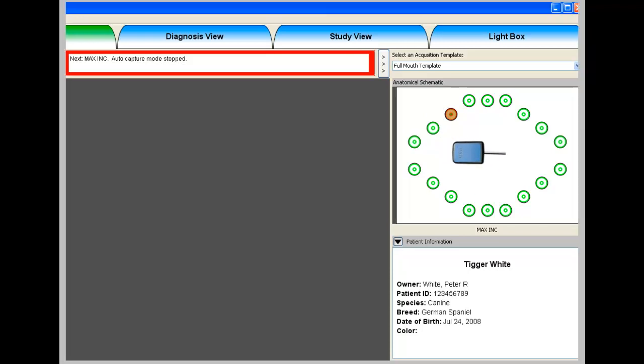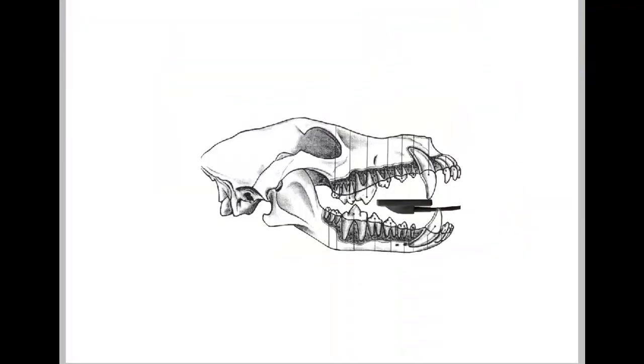And to take a look at our illustration here, that would be going to an orientation that's landscape now on the sensor.